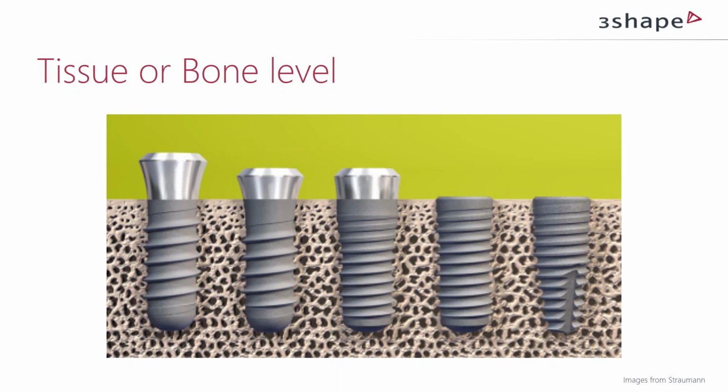Yes, as a surgeon, you often look for primary stability, so you know that the implant is steady in the site, and then you can expect some healing. Because after healing, after 2 weeks approximately, the implant becomes looser again, and then osseointegrates for real after 4 to 8 weeks or something like that, depending on system, of course.